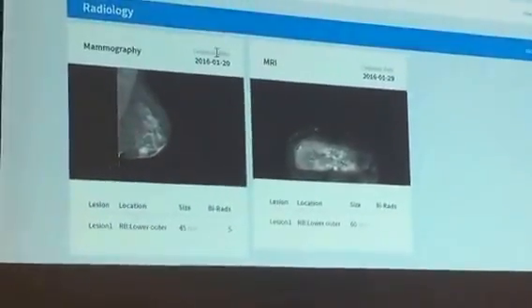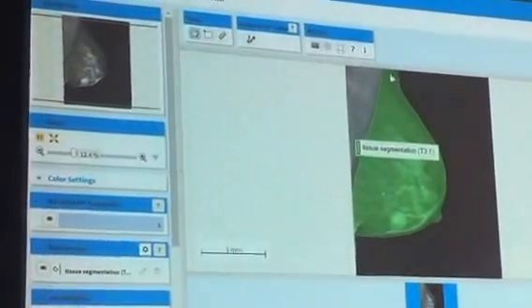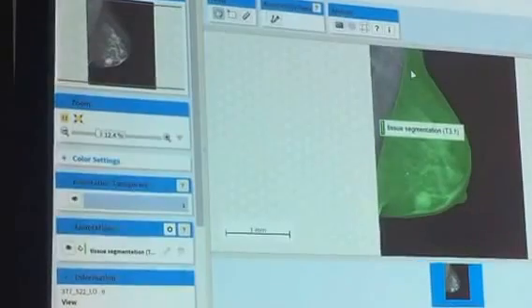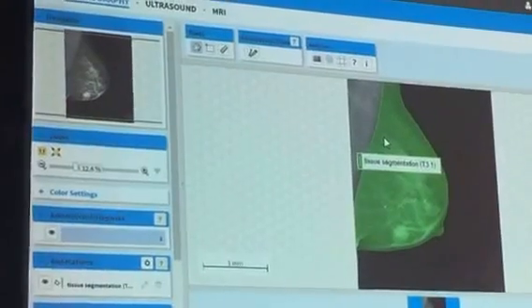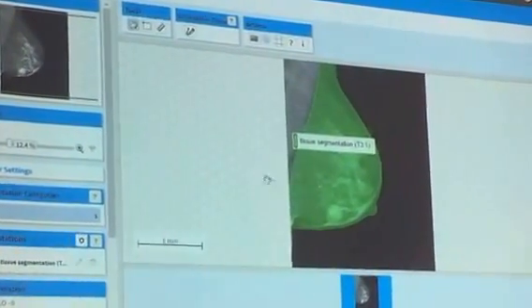As you can see here, in the radiology, we have also the image information. We can open the visualizer, and here we see what Ivan explained before. We have the mammography, and here we will also have the tissue segmentation, and other algorithms will be running to get other biomarkers for the decision-making process.